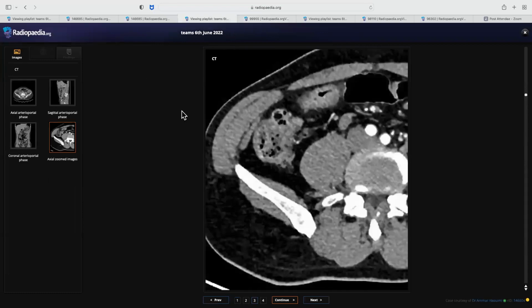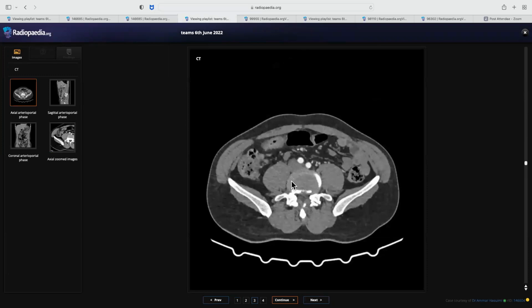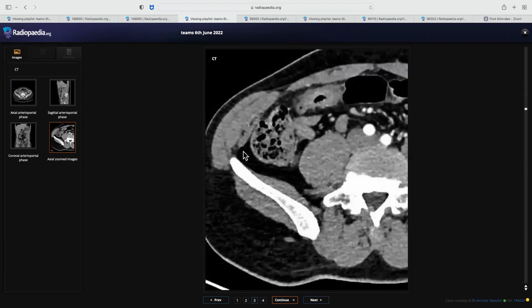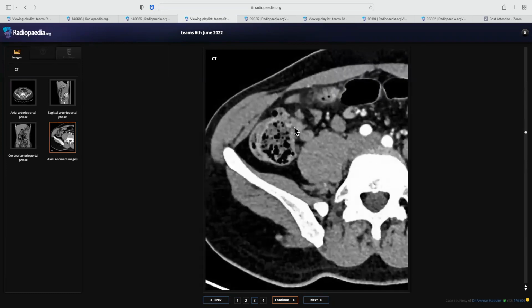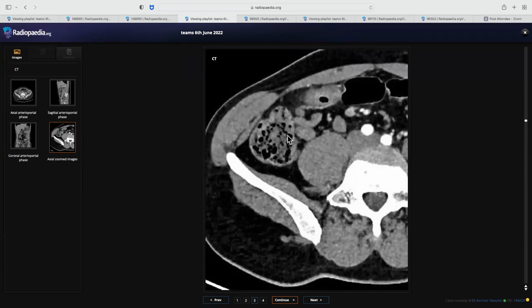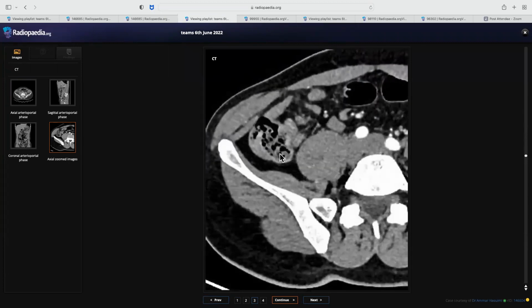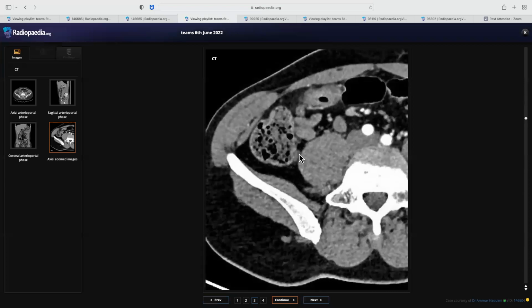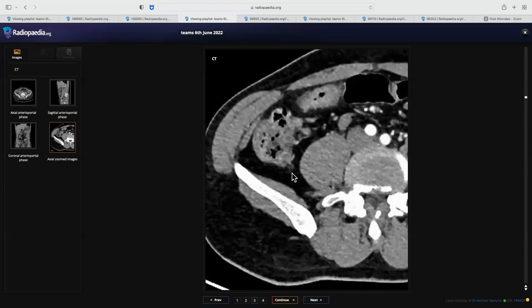Basically. Okay. This case, if you see this, this is the ileum, that's fine. And you see this structure. If you see this zoomed up image, see this. And so that's Meckel's diverticulum. Okay, I thought it was the appendix. Yeah, appendix you could see in this case. See, this is the appendix. This one. Yes, appendix, right? See?